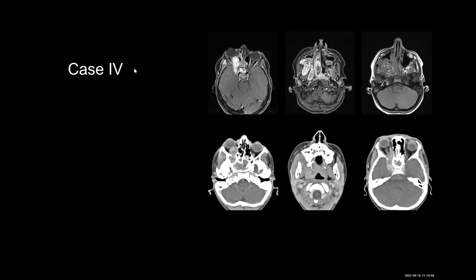The main thing here is just expansion, but mainly the lesion is in this region. You have to do mapping and start with the embolization, and it has an incredible response. Can anybody let me know what the supply is? From where is the supply?